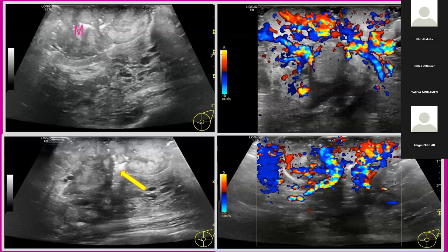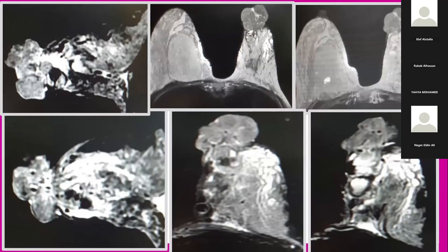Let me go ahead, although the patient is not prepared, and at least do an MRI, anatomical sequences, to see what is going on. And this is her MRI, okay? Just pre-contrast T1 and T2.